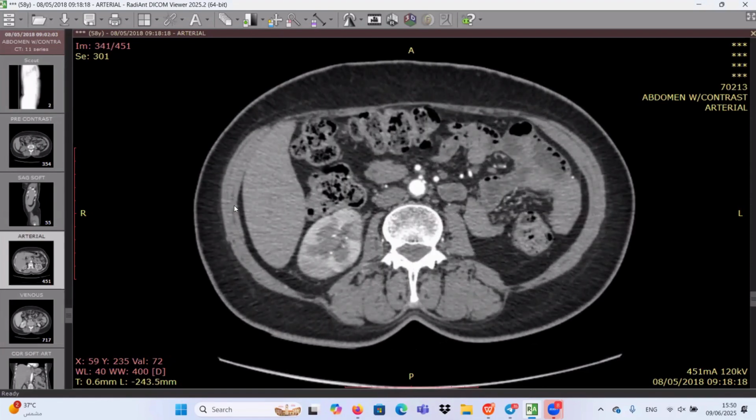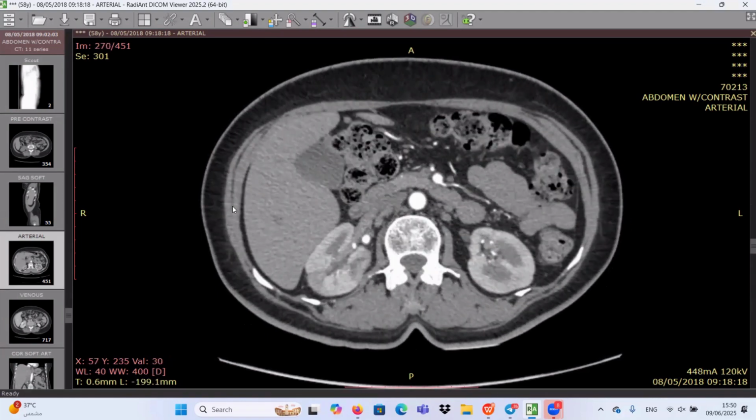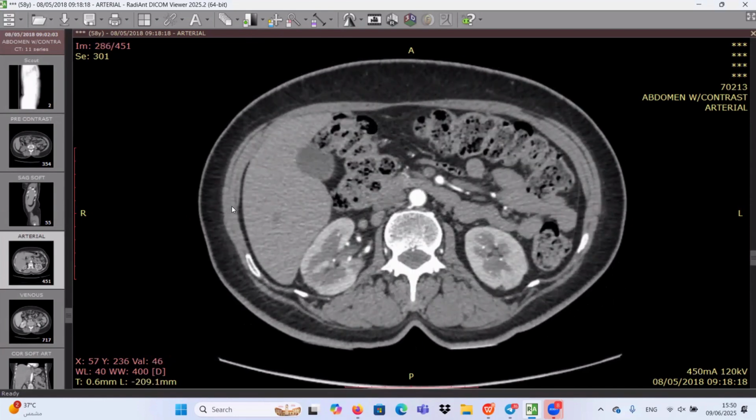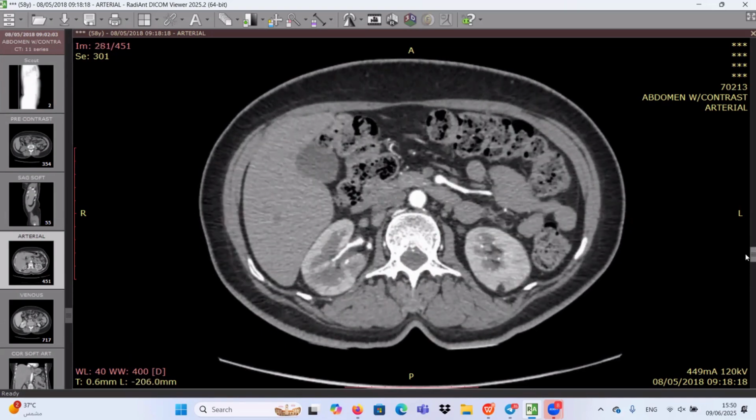Yes. So I'm presented with a contrast-enhanced CT of the abdomen in the axial cut. I'll scroll from the first to the last section, and then I will give my comment. Can you please go up, sir?